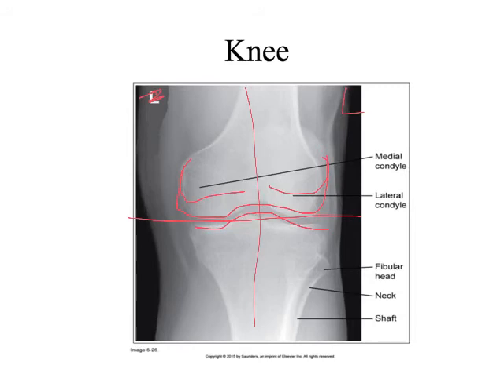We're going to see a little bit of superimposition between that fibular head and the tibia, right? We can't really avoid that. But the main thing here is to make sure that that joint space is open. We'll see the patella just a little bit superior to the joint space.